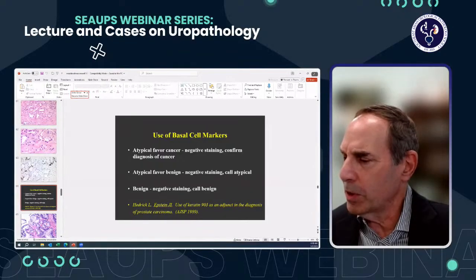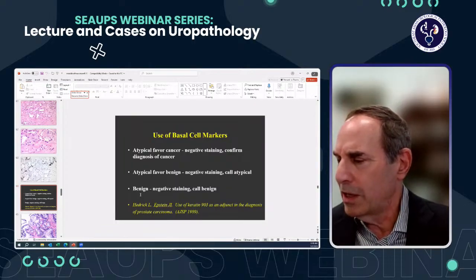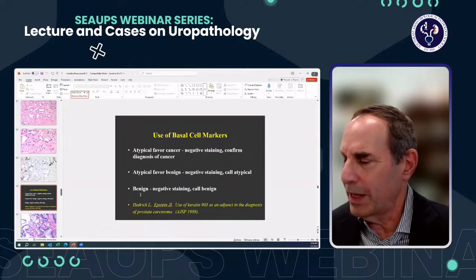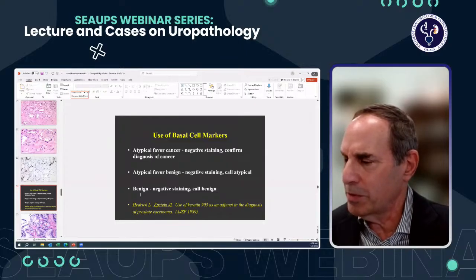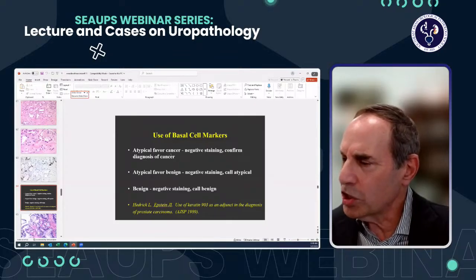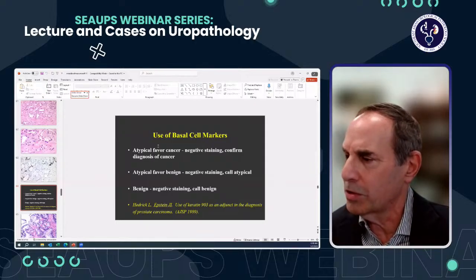I'll call that atypical. If it's benign on the H&E, I don't do staining, but I often receive, for example, consults that have staining associated with them that they've done on the outside. And I look at the H&E and I say, this is partial atrophy, or I'm comfortable, it's just another benign gland that sometimes is negative. I'll still call it benign. So again, basal cell markers should be used in conjunction with the H&E, and the H&E is the most important, not the basal cell markers.